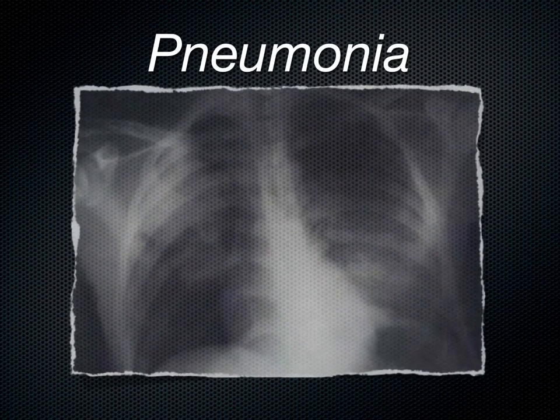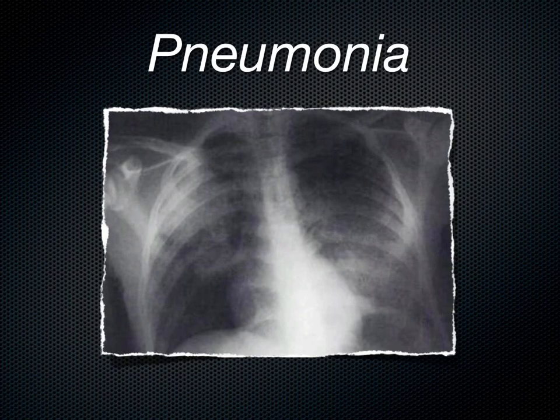Moving on to pneumonia. This is something that's been going on in Europe for years, is the evaluation of parenchymal lung disease with ultrasound. And we're just now adopting this in the States and becoming more comfortable with the fact that chest x-ray is not the only test that we can use to determine position, location, extent of pneumonia.